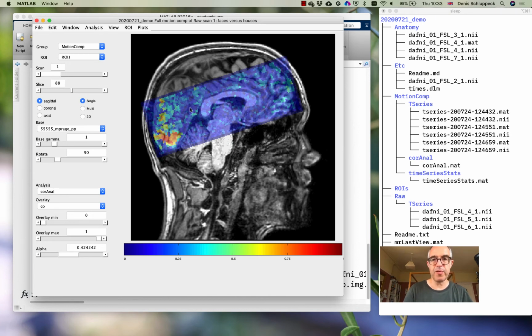So there's a couple of cool things about the way this is implemented, which is that the rotations and the interpolation for displaying the data are only applied for visualization, right? So the code leaves alone the actual data cube, so there's no resampling or interpolation that happens to the data. Any calculations always happen in the scan space, unless you do some extra steps.